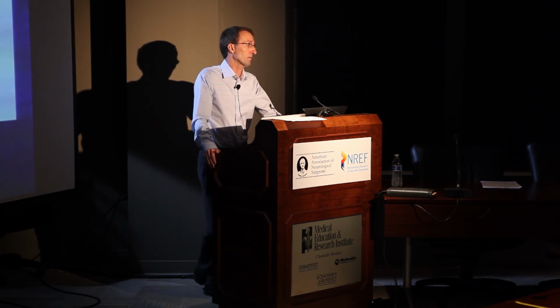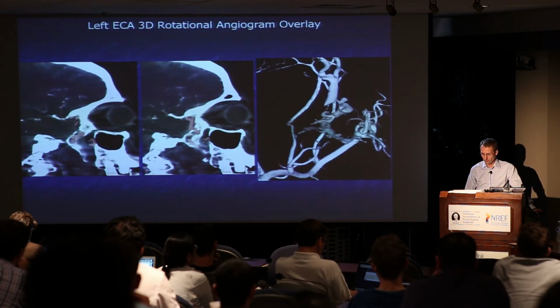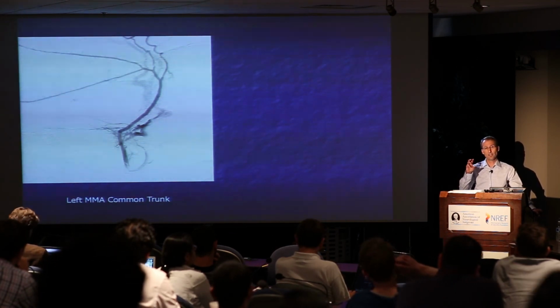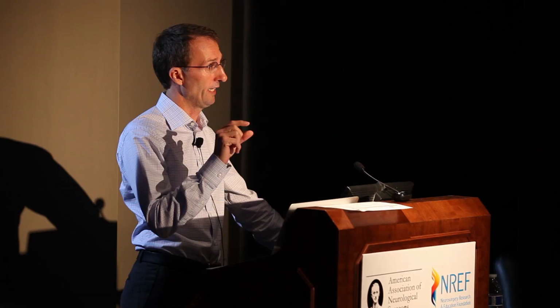Yes, you have a question? Sorry, can you point out again what tells you what part is the fistula and what part is the pouch? Sure, that's a great question. Unfortunately I don't have the entire angiographic run here, so you have to look at the earliest part. I do this like you're filming an AVM, on fast filming, as fast as possible. You want to look as early as possible in the angiographic run to see where the fistula actually forms, and then you can see the actual outflow of the fistula. My next case, if I can get to it, has a better example of that.